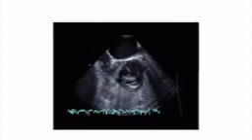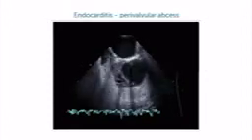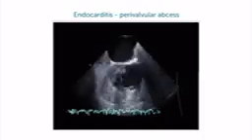For example, in this case here, it's quite simple to see AR, but sometimes information is hidden, and sometimes you will need additional imaging modalities, for example, transesophageal echocardiography. And this is the same patient now. Look what happened in this patient. Well, he has a bicuspid valve, but not only that, there seems to be a massive infection on the aortic valve. So the key message here is, in most cases, yes, transthoracic echo, but sometimes you also need a TEE study.